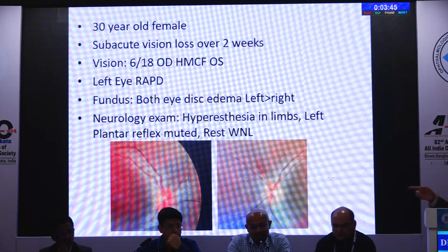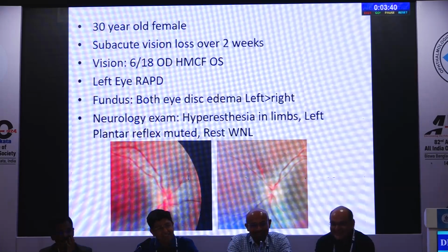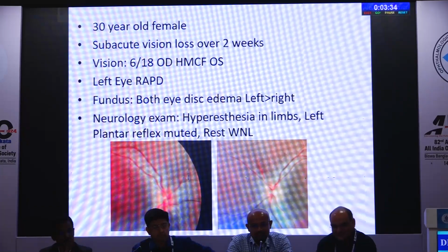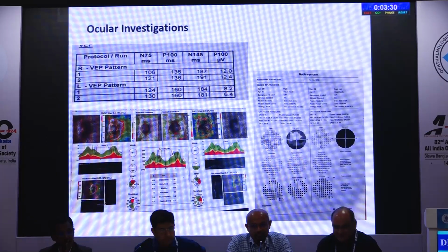Okay. This, in fact, Dr. Rashman only has to discuss for us. So this is a patient who has very poor vision. There are bilateral swollen discs appearing. There is a papillitis. Again, it is a female in that age category.